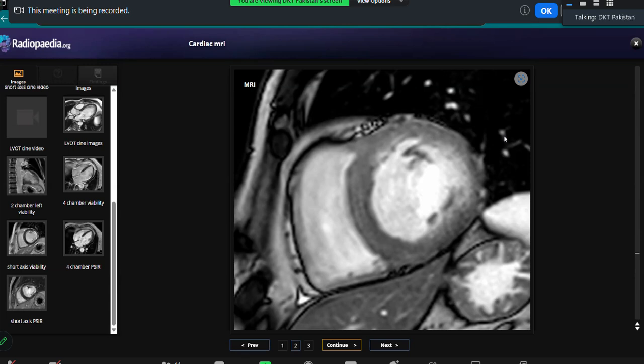Okay, so this is the standard landmark for measuring the ventricle. We do it in the short axis sequence, in the diastolic phase, and we measure it. We usually also see how the slice was taken and we measure at the plane of the slice taken. And this is how we take the standard measurements of the ventricles in diastole.